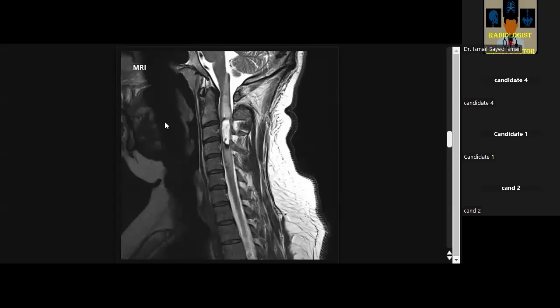Give me a provisional diagnosis from these 2 sequences. Considering the aforementioned characteristics, I'm thinking of an intra-axial lesion, and my main diagnosis is ependymoma. My differential is an astrocytoma; however, I expect this to be more eccentric.